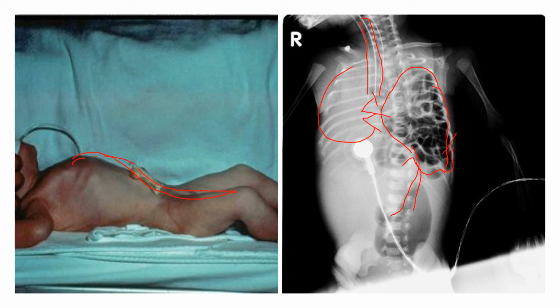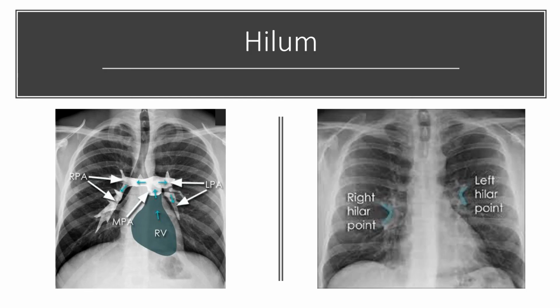Because what happened here is, do you think that this left lung really developed if it's being crushed during utero development? Absolutely not. So that left lung is going to be very small, very hypoplastic, and so that's going to impede this kid's ability to breathe and survive, especially if they're premature here. So this is a CDH, that's that gastric part. So gastric can play a huge role in someone's ability to breathe, and so that's hopefully something I've highlighted for you. A, B, C, D, F, G, H, so we've just finished G, which is gastric.